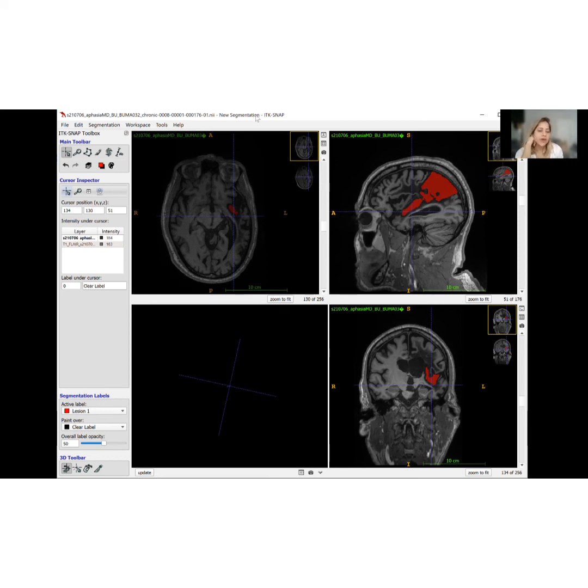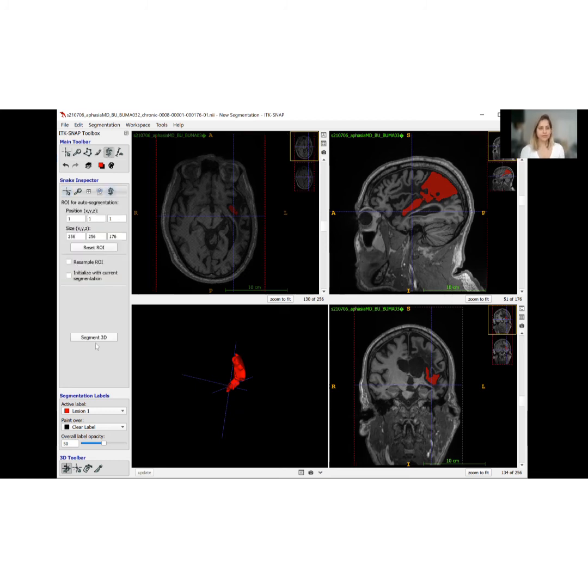Can you update now in the fourth window, so that we'll be able to see the shape of the map that is created now? Yes. This window will show you the three-dimensional shape of it. When you press update there, this is what you get for the lesion map for this specific classifier. So you can either save this shape or save the whole workspace, as Isaac said. Okay, great. Now we'll go in and do the same thing for the second portion of the lesion.